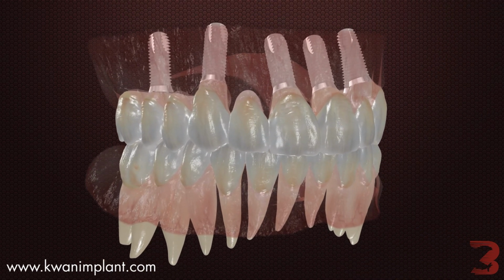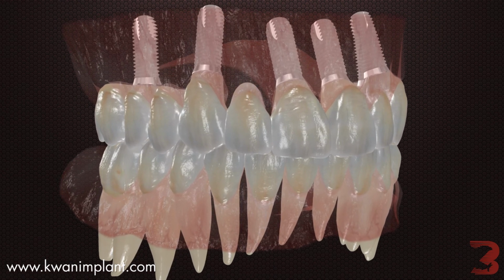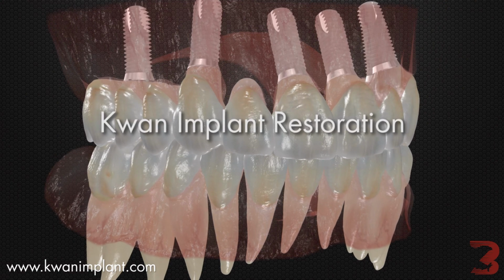The Kwan implant restoration method allows the fabrication and insertion of a one-piece implant prosthesis in one single step after implantation. Kwan implant restoration.